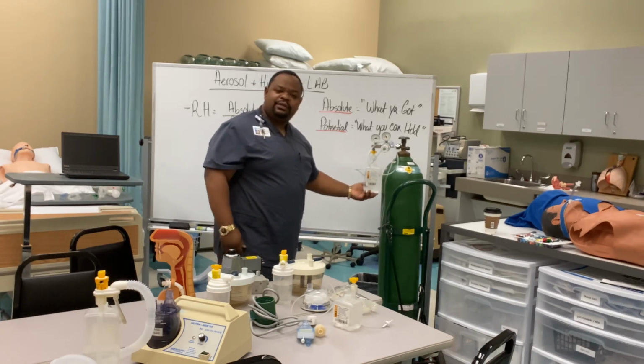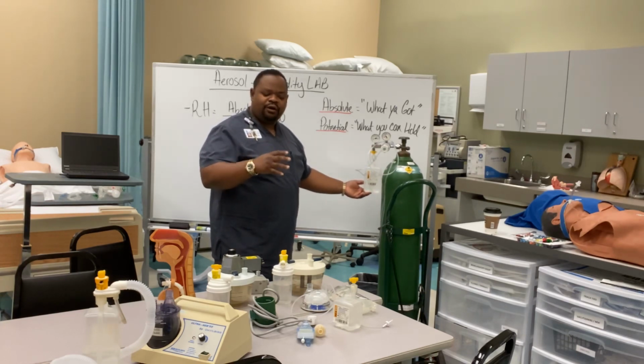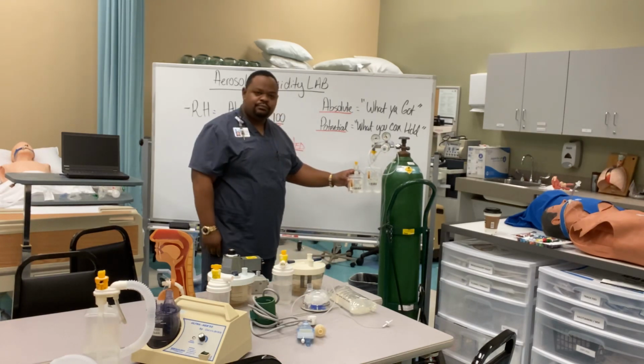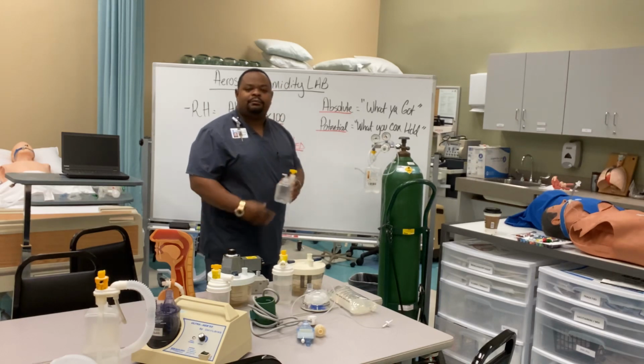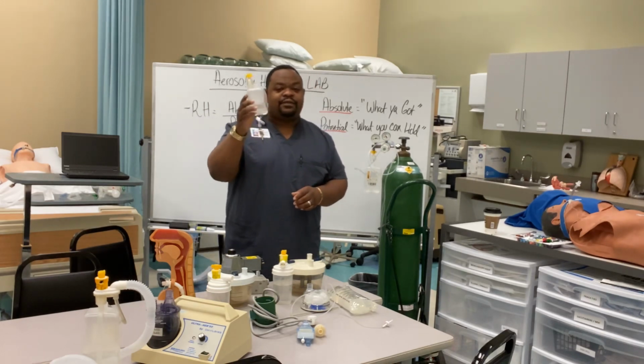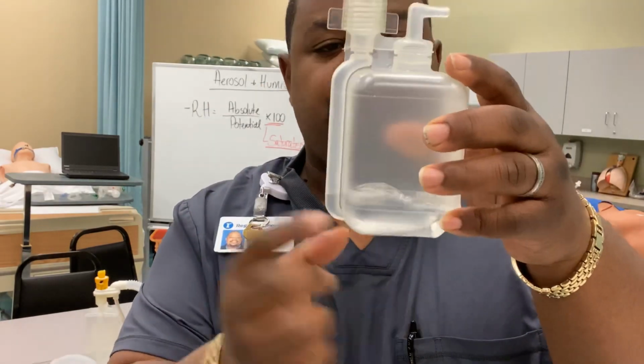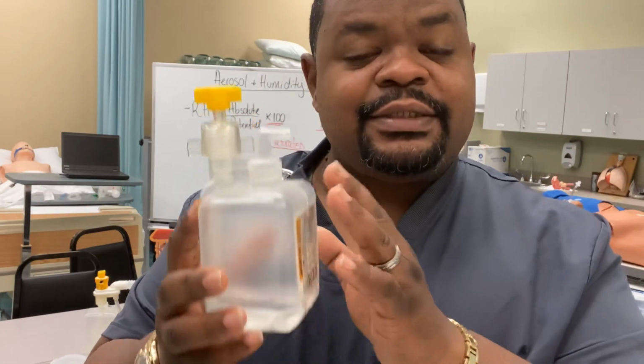So this is a larger bubble humidifier, right? It's kind of large. The most ones you'll see look like this. See how much smaller this one is? This is smaller than the larger one, right? And so what happens is this one has less contact time, right? So if I use this humidifier, then you'll notice that the gas that travels through here doesn't have much space to pick up a lot of moisture, right? So the contact time is less. So patients that are on this humidifier may have less humidity than those who are on that humidifier, right? Because of what? Contact time, right?